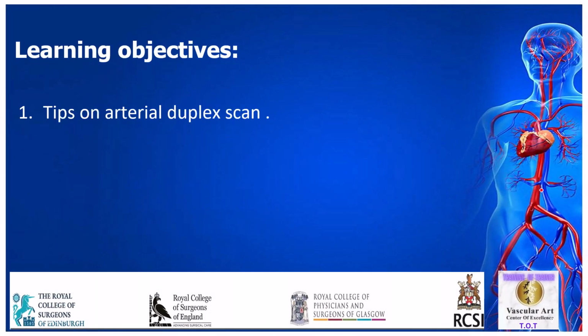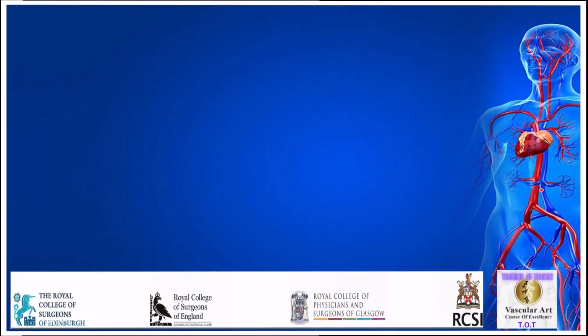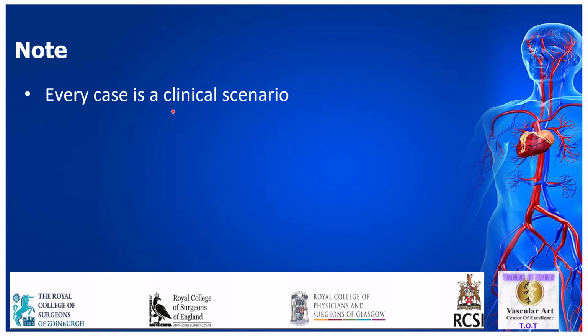My learning objective of this lecture is to give some tips and tricks about arterial duplex scan and how to reach a correct duplex diagnosis. It's very important after having a duplex course to have a practical application of it. And I always like to mention that it is very important to have a clinical scenario that you gather from history and a quick examination.